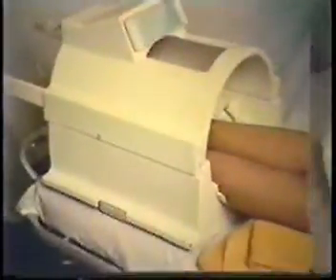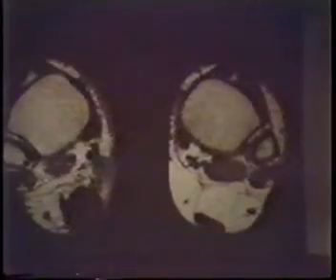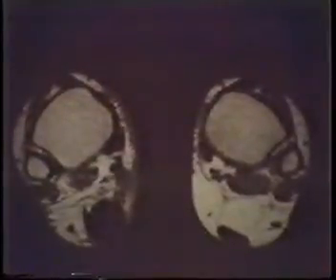We've looked at ankles. Several people have looked at Achilles tendon. This is what a chronic Achilles tendon tear trauma looks like. This is the normal side. It gets big but stays black if it's chronic. If it's acute, you see in acute tears, you see high signal intensity in the area. And this is a marker we use.